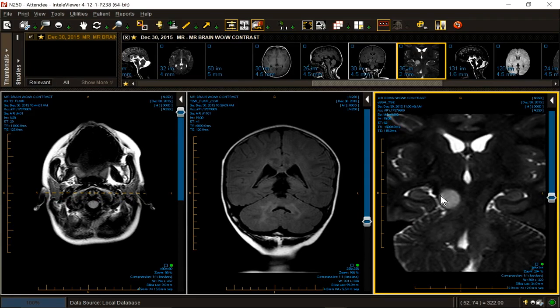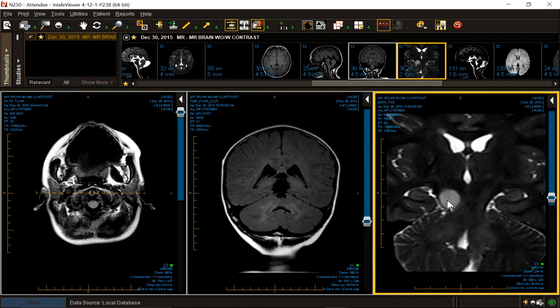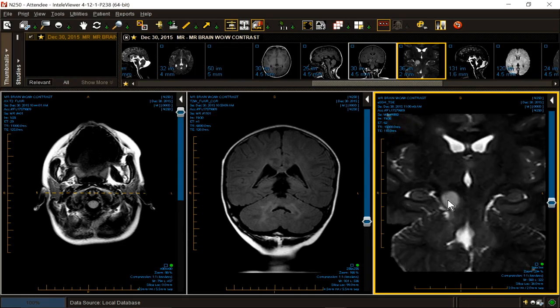So this is the lesion that was of concern. This is one of the lesions that had a voxel dropped on it: low NAA, elevated choline. That doesn't tell you much without one of the other metabolites rising, like lactate or lipid, which it did not.